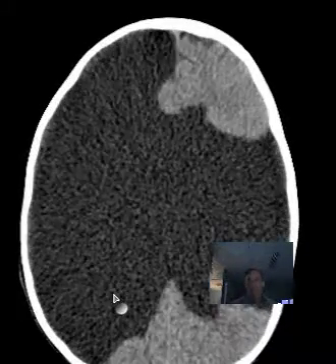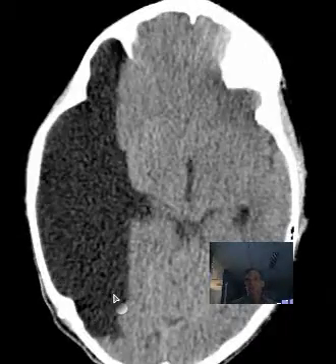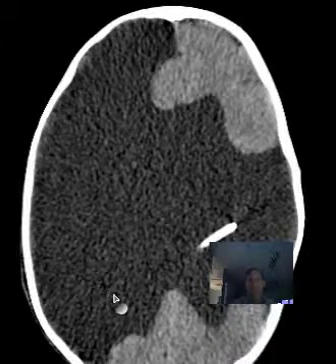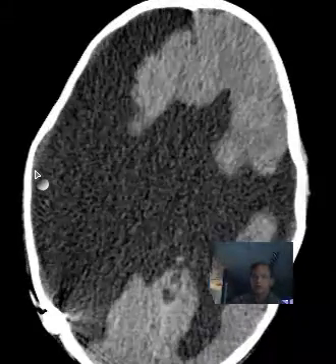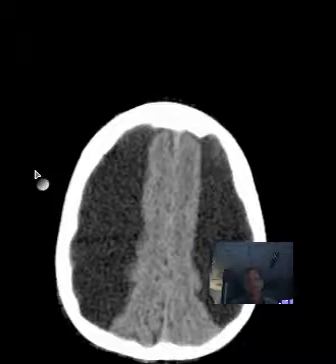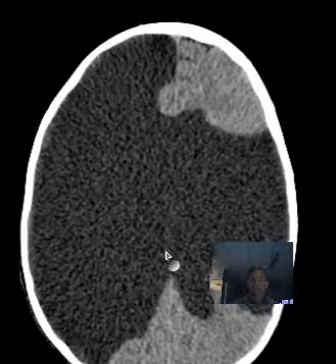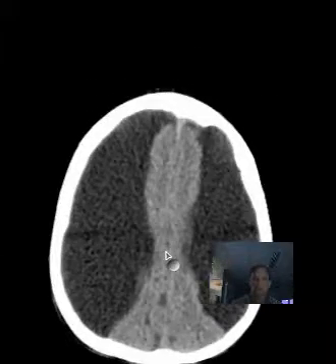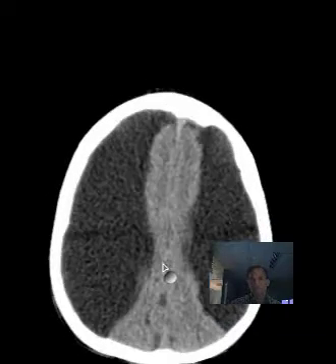This patient had some difficulty draining the fluid, apparently. They put in a ventricular shunt catheter, presumably because this large fluid collection is not draining properly. And it's not really too surprising because we don't have the normal ventricular architecture, and the arachnoid villi that provide drainage in the area of the sinuses, particularly the superior sagittal sinus, may well have been affected.